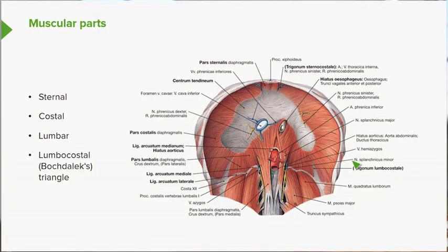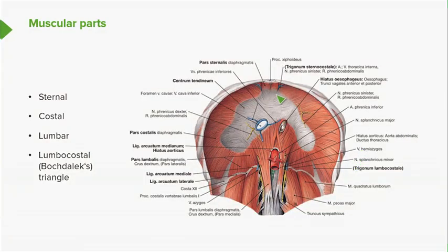The diaphragm, as mentioned earlier, does have a central tendon, and we see the central tendon in this area here, and then we see the striated muscle fibers that make up the diaphragm that are more peripherally located. And they extend all the way along the movement of the cursor here. We can divide these muscular parts into a sternal part of the diaphragm.